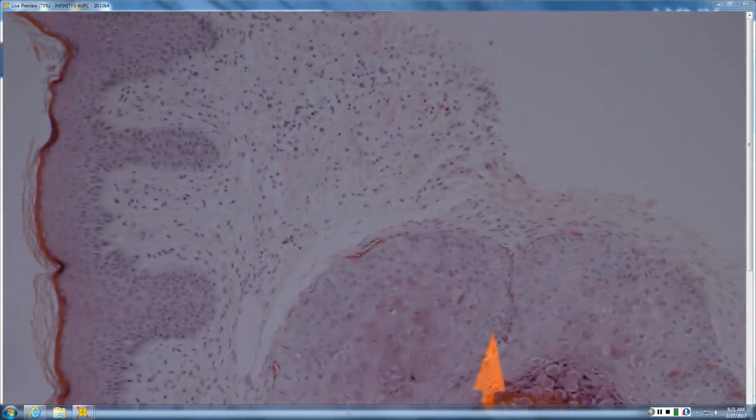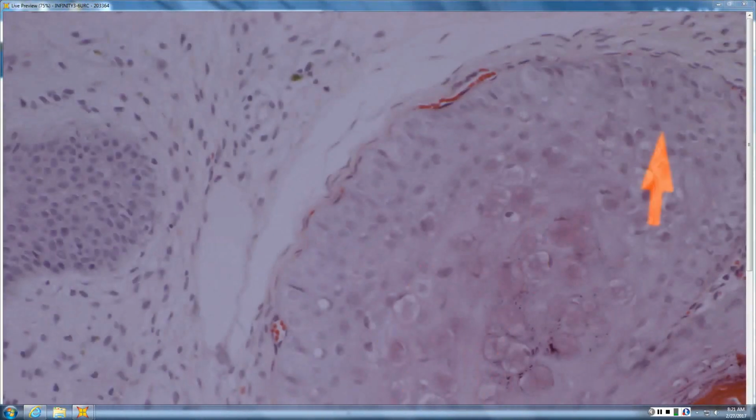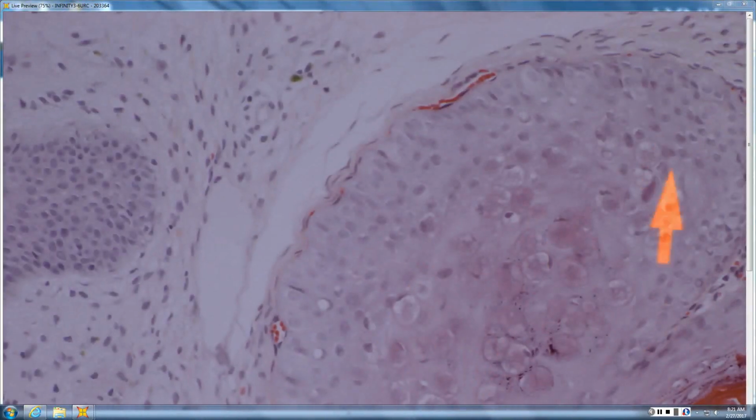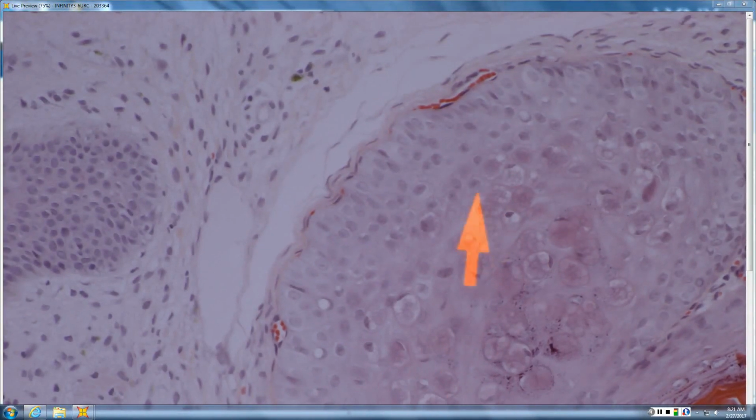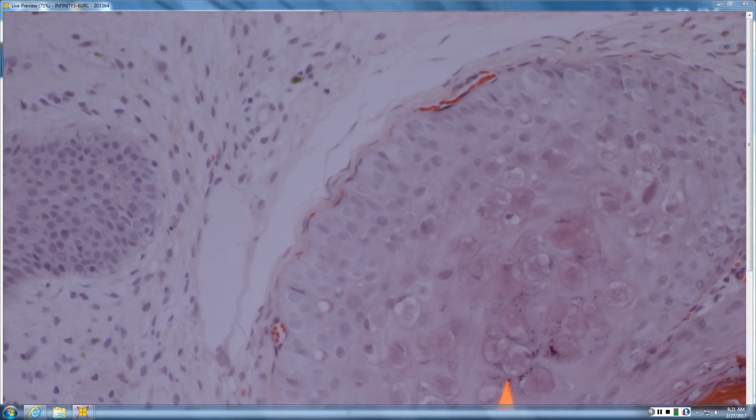The other thing that's important is for the fellows. This change here, that's what not quite Henderson-Patterson looks like. So that is fair and I think testable for a fellow, is something that is not quite there, because any idiot can recognize a Henderson-Patterson body. It takes a special idiot to recognize the changes that aren't quite there yet.